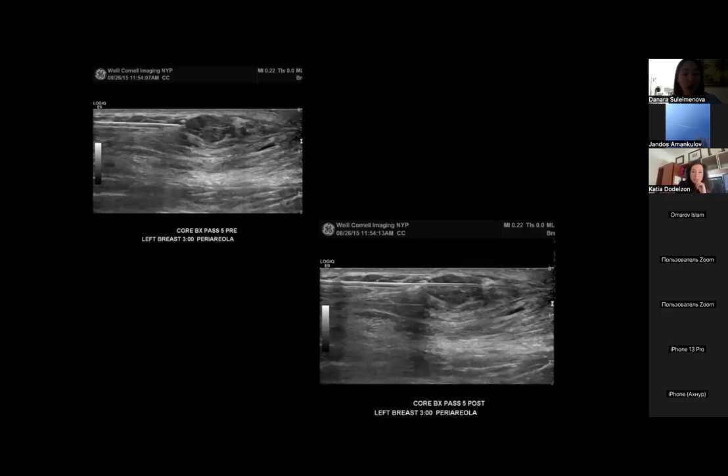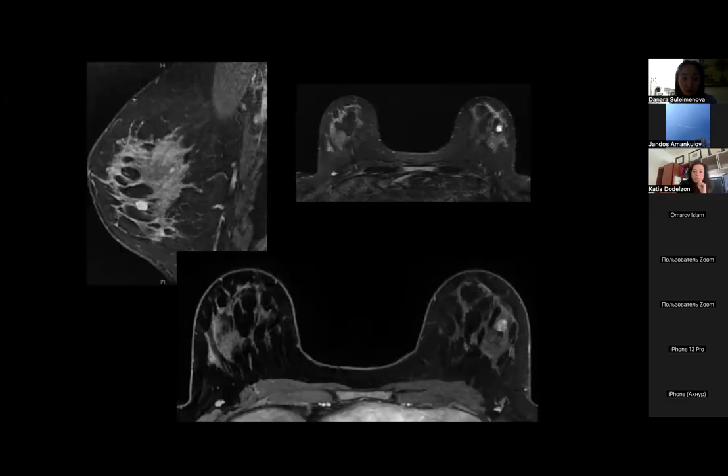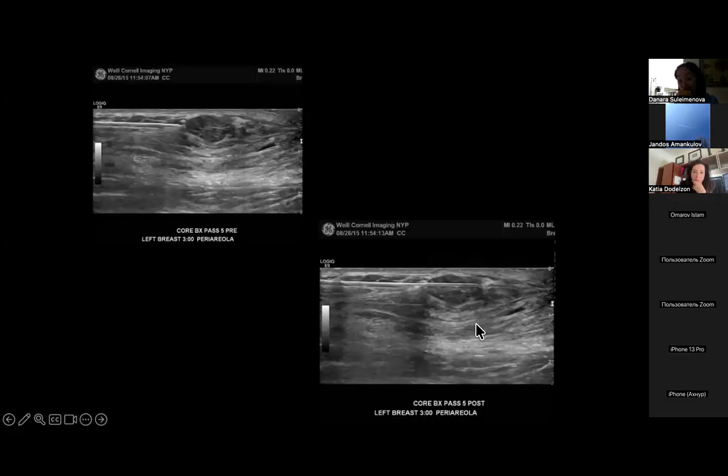In fact, in this particular patient, we went back and looked under ultrasound and saw an oval parallel mass. This was new, so it did undergo a biopsy and ended up being just a fibroadenoma, which corresponds to this mass here. But usually they're oval, well circumscribed with these non-enhancing septa, which is highly suggestive of fibroadenoma, and they tend to be T2 hyperintense otherwise.